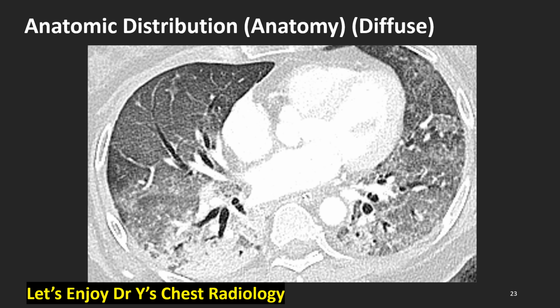Anatomic distribution, diffuse. We see diffuse ground glass opacity and consolidation in an ARDS patient.